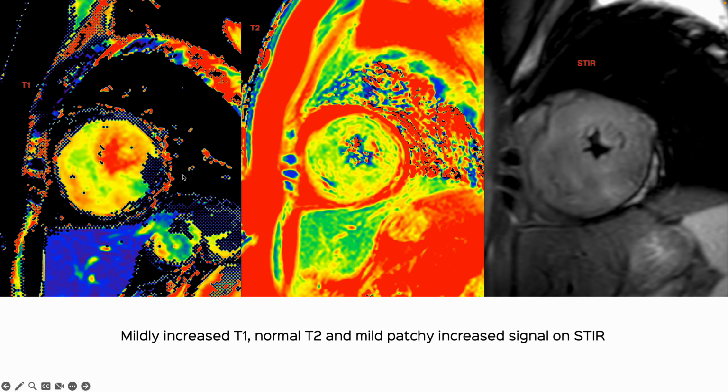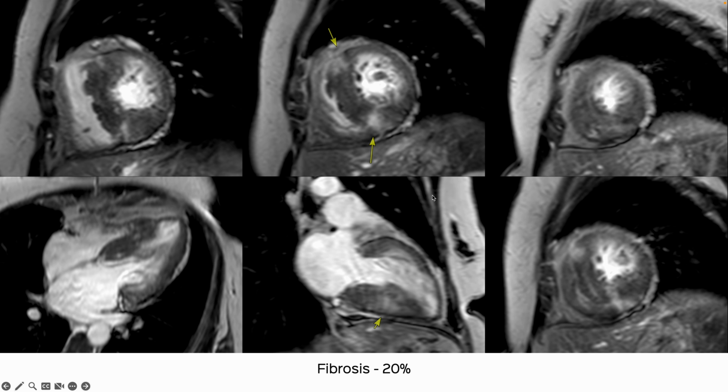The multiparametric doesn't add much. The T1 values are a little elevated as would be expected. T2 were normal, and the STIR shows this unusual increased signal which is quite typical of HCM, not mentioned in the books, but it's something we see in patients who have significant hypertrophy. And then the late gad images show patchy fibrosis, which involves about 20% of the myocardium. So we have to do the quantitative measurement as well.